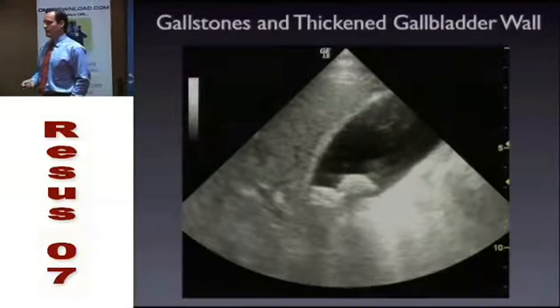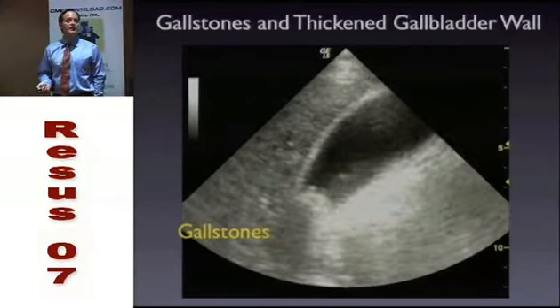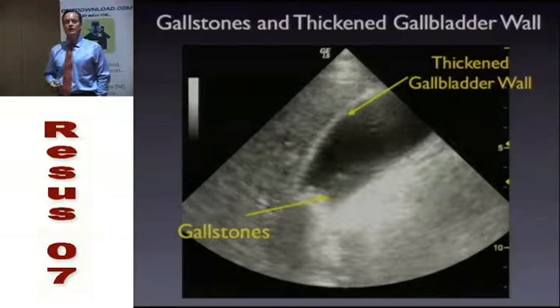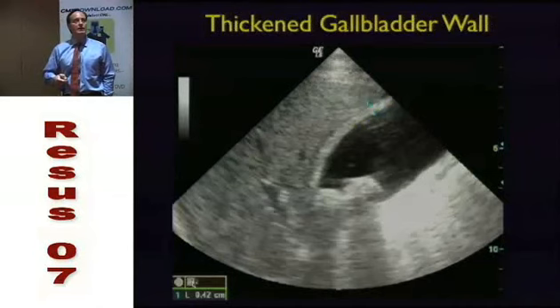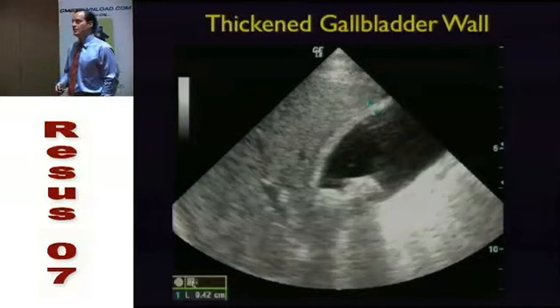All right, well, here's an example of a cholecystitis patient. And here we have a gallbladder. There's definitely gallstones there, right, guys? Notice the gallbladder wall. Do you guys see the thickening of the wall there? Okay. And when we measure the gallbladder wall, we always want to measure the anterior wall because notice here, the sound waves are coming through the bile and lighting up the posterior wall, making it hard to actually measure. There it was actually 4 millimeters, so that fulfills the criteria of greater than 3 millimeters.